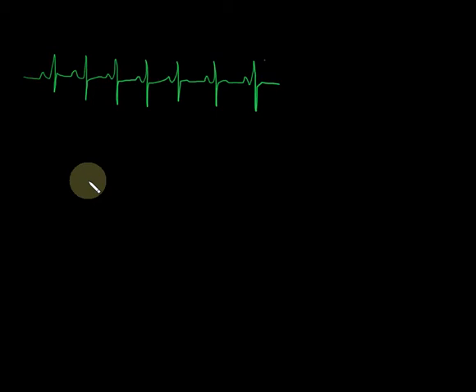That becomes extremely important starting with this session here with the AV blocks. And if we looked at this, you would need to measure this against the graph paper. The PR interval is supposed to be, fill in the blank, 3 to 5 small blocks. So it should be from the start of the P wave to the start of the QRS, it should be at least 3, but no more than 5, or 120 to 200 milliseconds, 0.12 to 0.20 seconds.